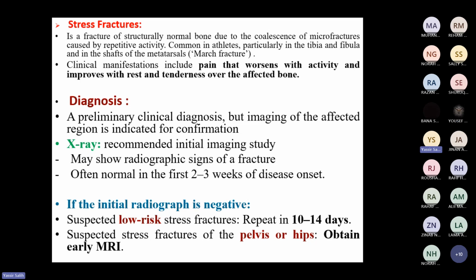Because as we know, any fracture heals by callus formation and calcification. So we get calcification at the area of fracture. This should attract your attention that there is a fracture here and you might miss it, due to no fracture line. So calcification occurs, which shows you that there was a fracture at this area. Sometimes you can see the fracture line within this calcification.